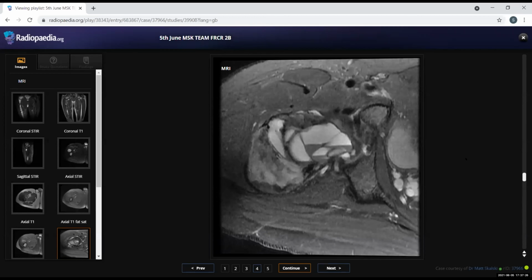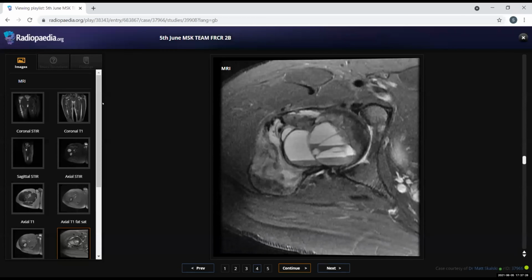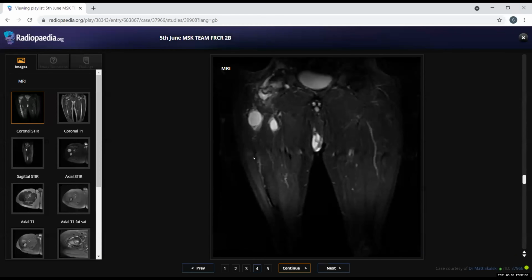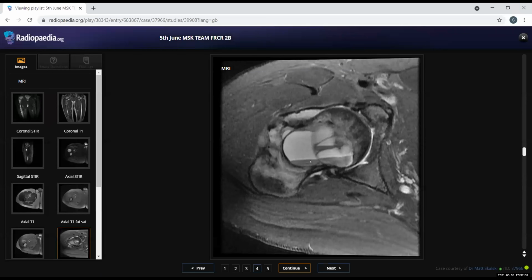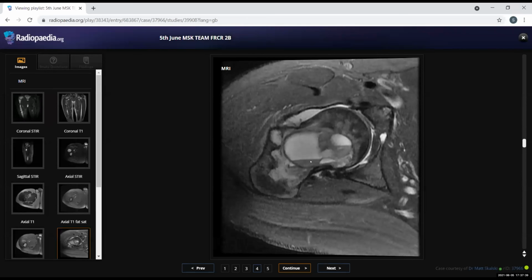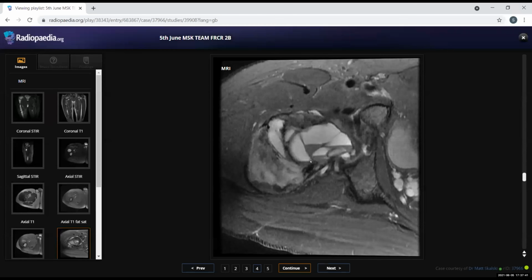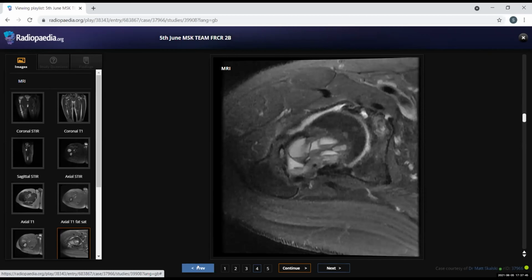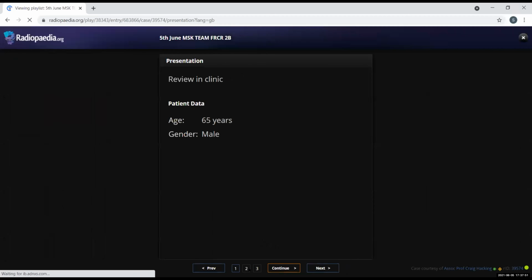Can I take the mouse? Our time is up. I'll just start with the review. You are right that this is polyostotic fibrous dysplasia, and you rightly picked out the soft tissue myxomas. So this is Mazabraud syndrome. You rightly picked up the fluid level, aneurysmal bone cyst, and aneurysmal bone cyst can happen with underlying fibrous dysplasia as well. So, fibrous dysplasia, intramuscular myxoma, cystic degeneration with aneurysmal bone cyst in combination, okay?